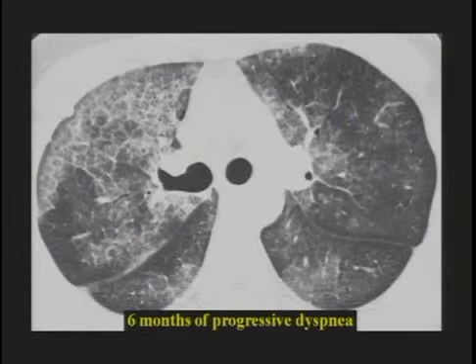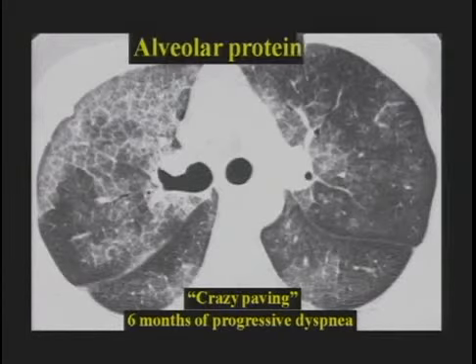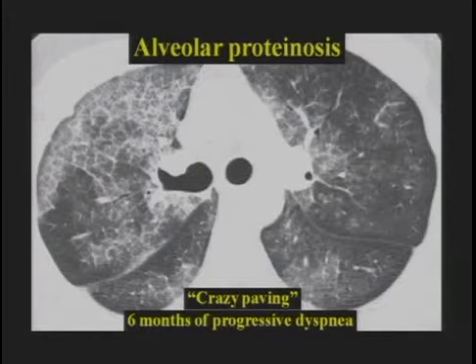Now, this is an unusual appearance of ground glass opacity, but I'll show it to you because it's quite typical. Patient with 6 months of progressive dyspnea, so ground glass with chronic symptoms. It's from that second list I showed you. This person also shows the appearance of crazy paving, where interlobular septal thickening is associated with the ground glass. And I should say as a disclaimer that you may see crazy paving in any cause of ground glass opacity, acute or chronic. But the appearance of crazy paving has become associated with alveolar proteinosis because it is a very typical appearance in alveolar proteinosis, but it is a non-specific HRCT finding.